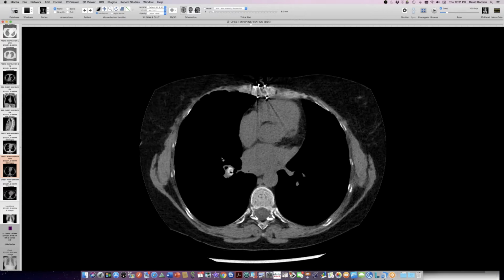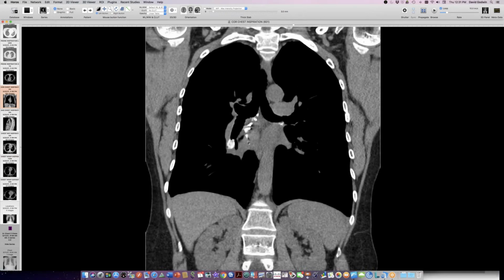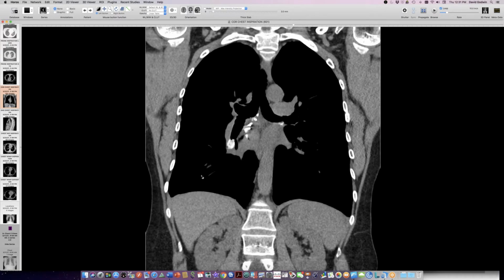And there is this very bright object sitting in a right lower lobe bronchus. So this thing is roundish, and let me show you on coronal. It seems to be roughly spherical, and it's very dense. And I think this was fairly recent after these sensations began. So this isn't a chronic lesion that has calcified over time. So this is very bright. And this was attributed to one of her tablets.